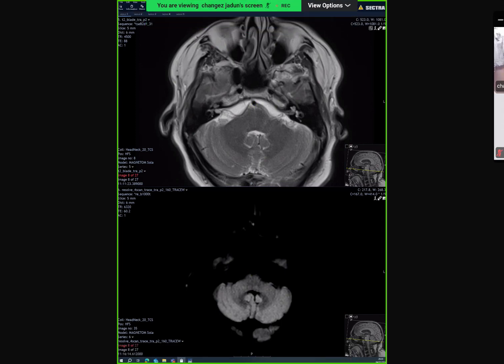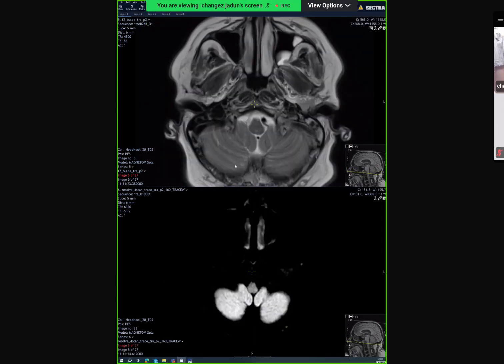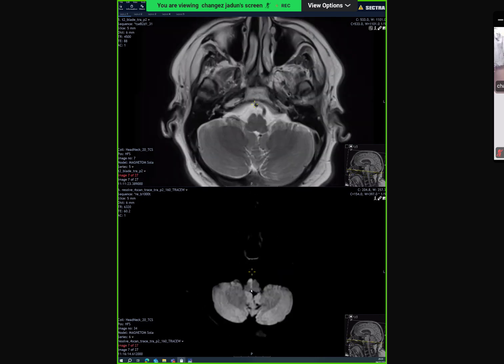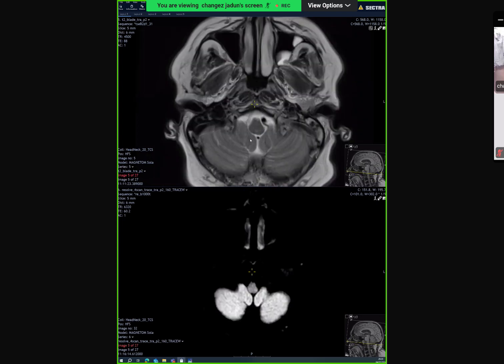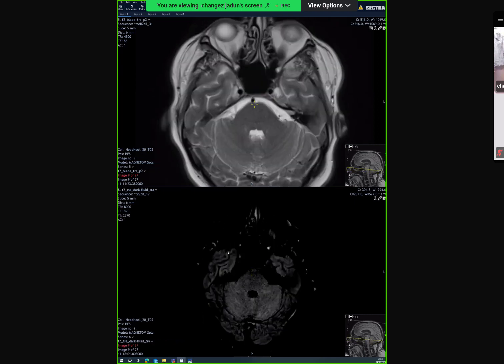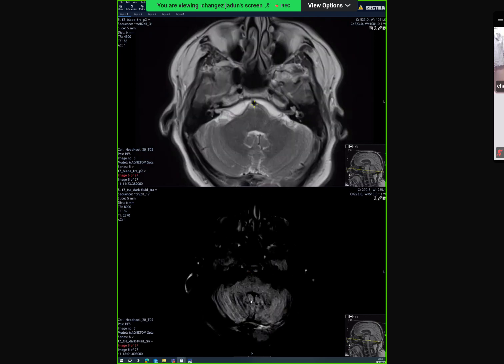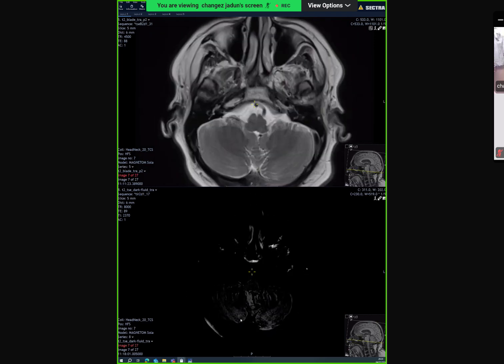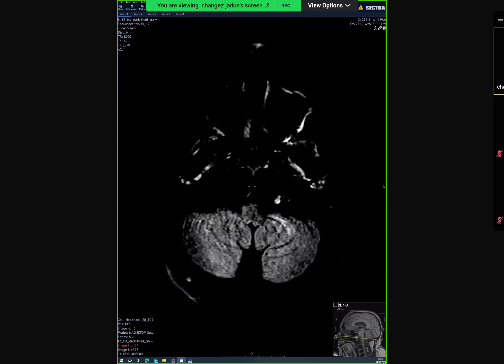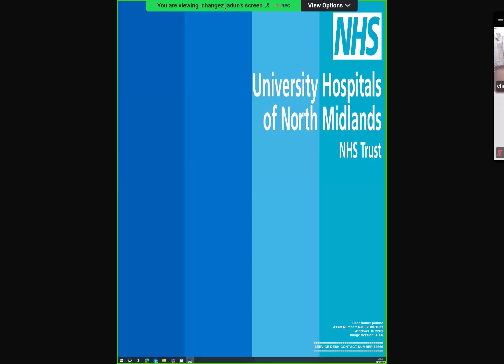Good, excellent. So to sum up for the audience, right vertebral artery loss of signal void, diffusion restriction, and the FLAIR signal change, subtle signal change of this area that we see. This you can see here, the signal change. So this is telling you that you got a problem here. Okay. And what are you going to do? CT angiogram and stroke team review.